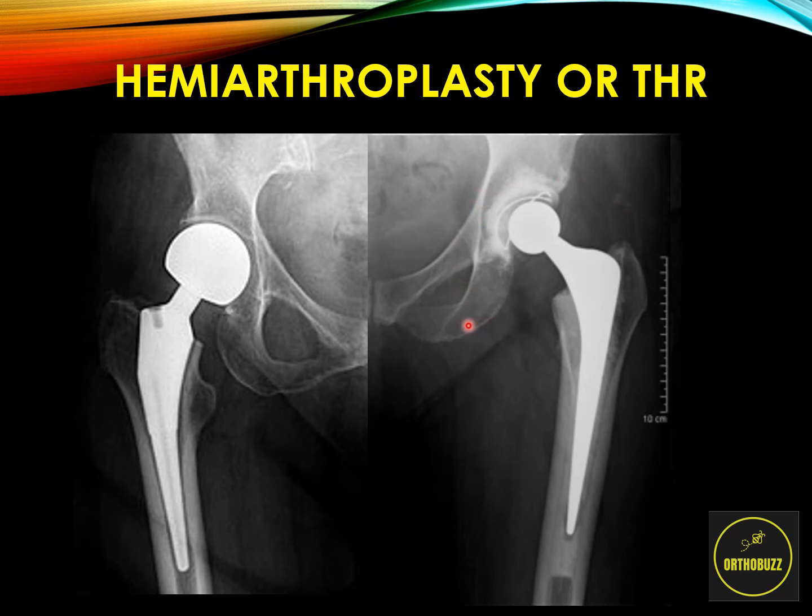The reason being that a total hip replacement has a metal surface on an acetabular cup which is made of polyethylene, and this gives better wear properties over a period of time. So for more active patients, this will last longer. However, there's a smaller head of the femur as compared to a hemiarthroplasty, and the trade-off is that this will be therefore less inherently stable and therefore more likely to dislocate than a hemiarthroplasty would.